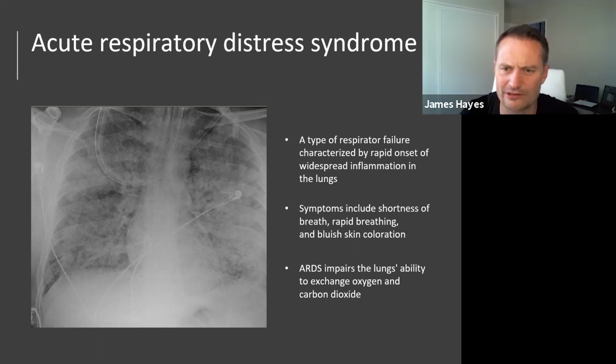Well, they're so ill that they didn't want to take the chest wires off their chest. Okay, so they're doing some pacing or something like that. And although it's great to have a radiograph without these wires on, the patient isn't stable enough to take them off, so they've done it with them on. They've also missed off the top. That's not a real problem because you're not really looking at the right apex. You're looking at the general chest here.